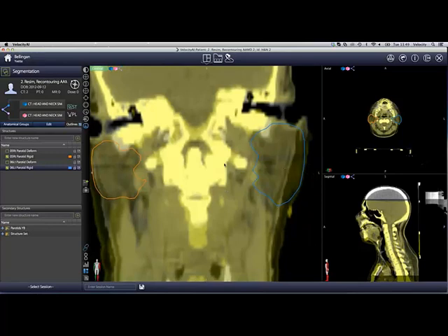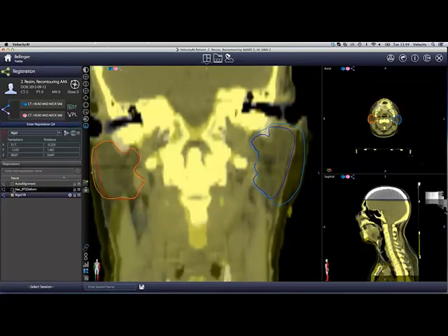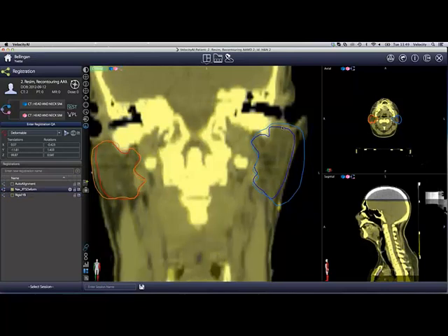All right, so once again, the arrow colors show the most movement, and the pink shows this area of movement. And once again, if we place our cursors here and we pull in, you can see the amount of warping on the side. All right, what I'm going to do now is show you the Jacobian.